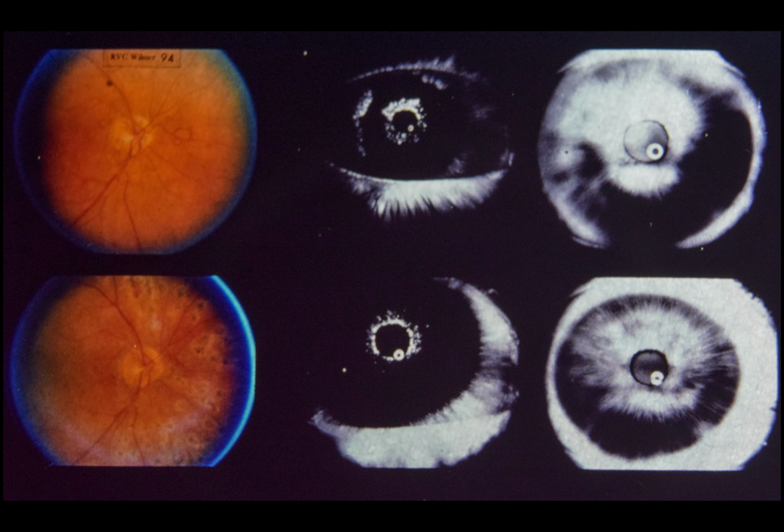Post-photocoagulation iris angiogram is shown below. Lower center, 22 seconds after injection, note marked diminution of peripupillary rubeosis when compared to the pre-photocoagulation angiogram above. Also note complete regression of new vessels along the temporal iris border.